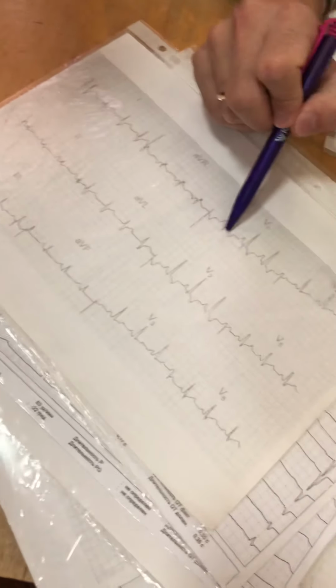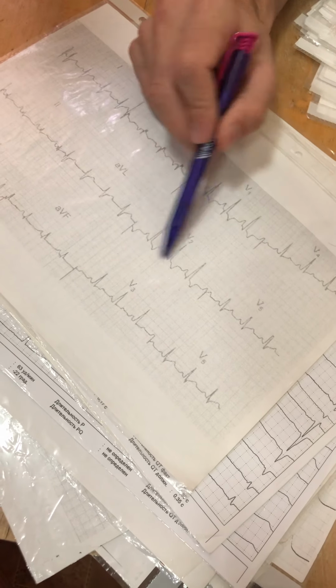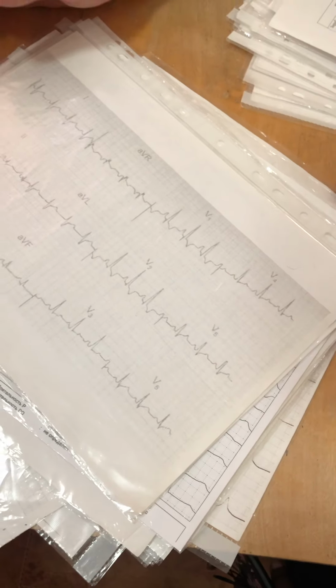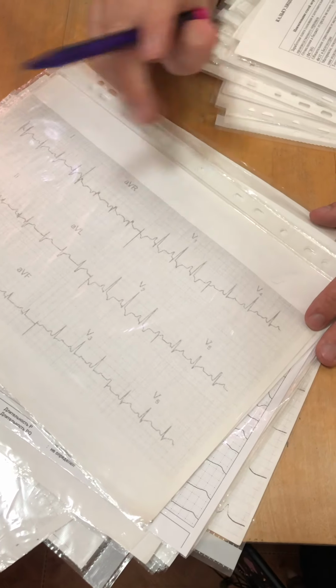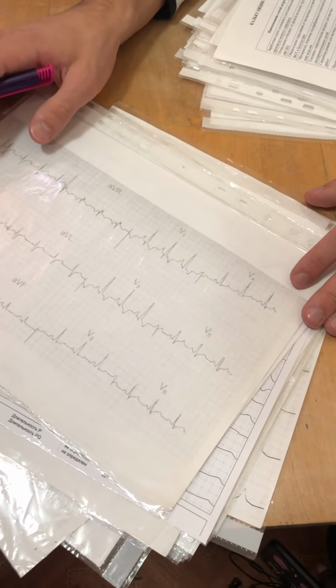And depression of the ST segment and negative T. Depression of ST, negative T. Ischemic signs. If the patient feels pain at this moment, it is an acute coronary syndrome with depression of the ST segment. It's possible that it is due to stenocardia or myocardial infarction. We should do a troponin test to differentiate.